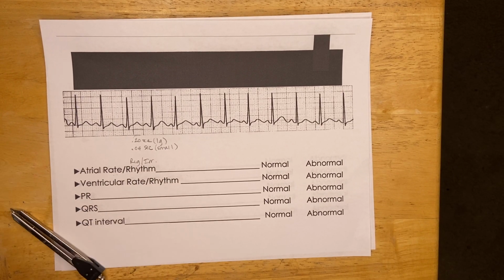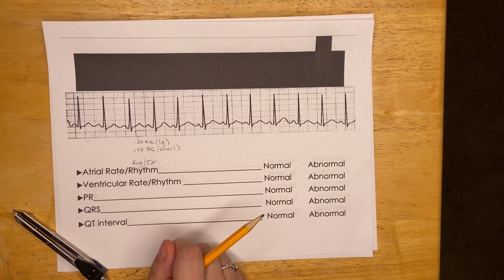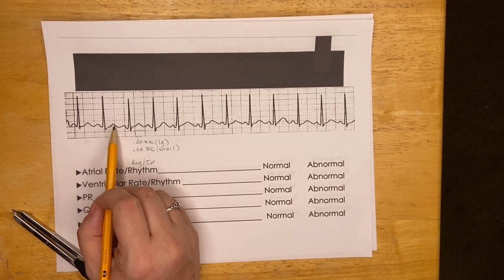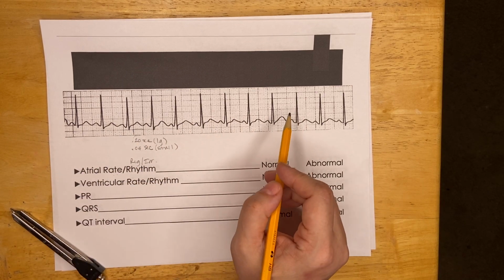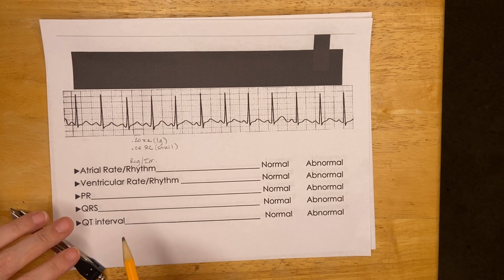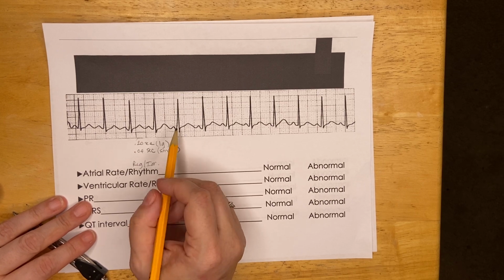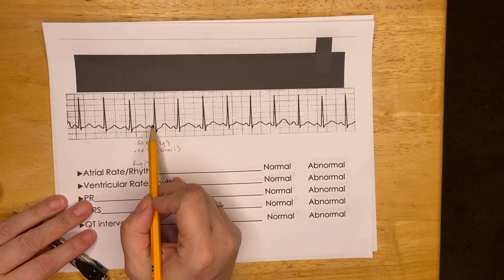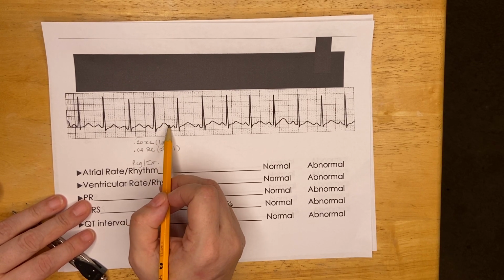They do it alphabetically and in order for a reason, and isn't that nice of them? I don't know why they started with P, but we've got P, Q, R, S, T. So a P wave, this is lead 2. Lead 2 is where most of our interpretation is going to come from, because everything's nice and upright and above the line, and we like that view of the heart for easier interpretation. So in a normal rhythm, I should see P before the QRS. It should be upright. Then I'm going to see a QRS and then a T.